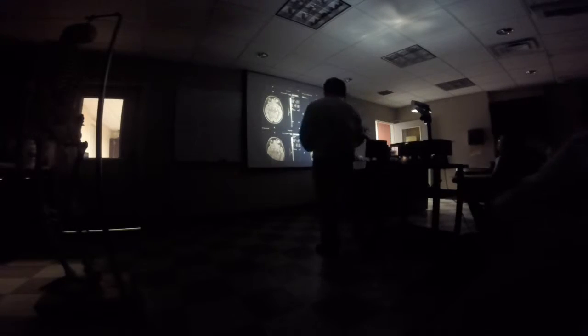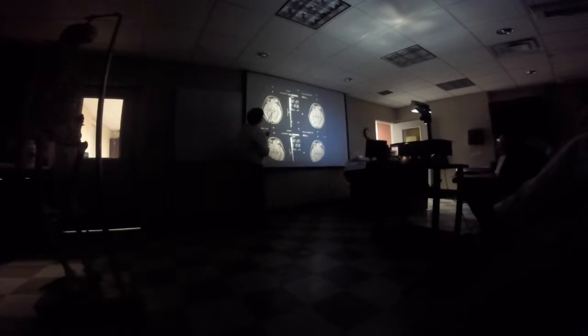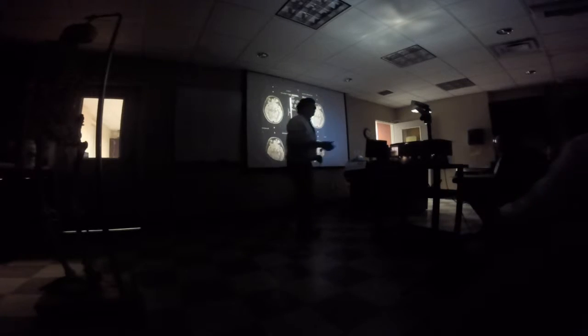Now I want to show you again. This is going to be the midbrain. And look here, what is that structure right there, passing right through the dorsal aspect? Cerebral aqueduct. And again, at the level of the midbrain, you see just the very top part of the cerebellum peeking through.